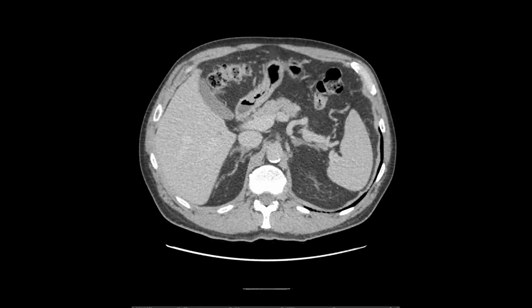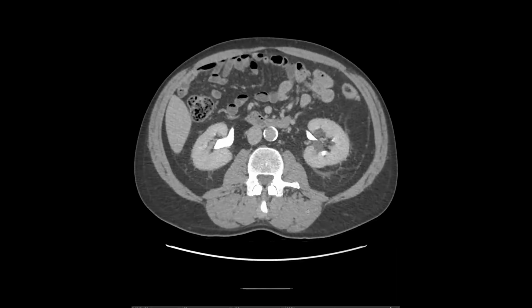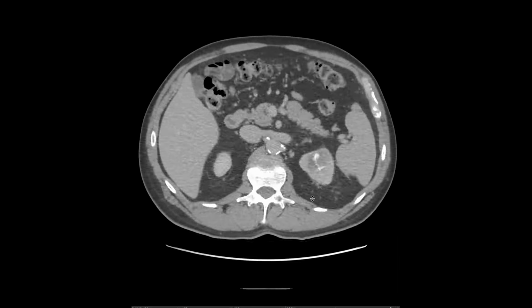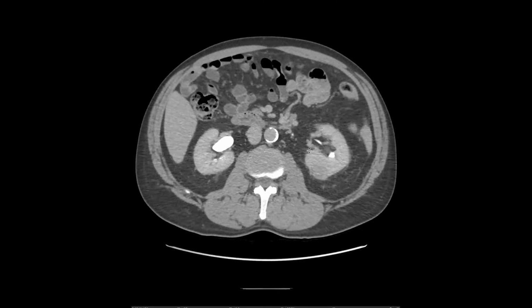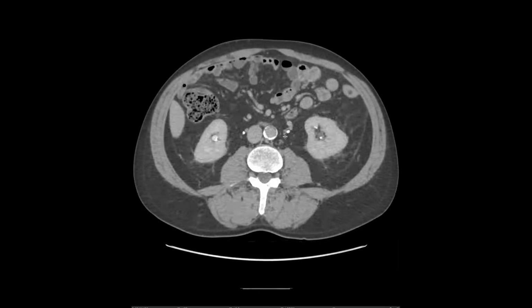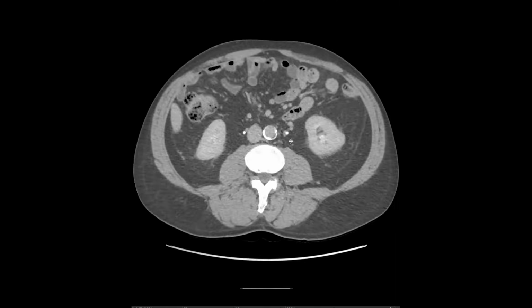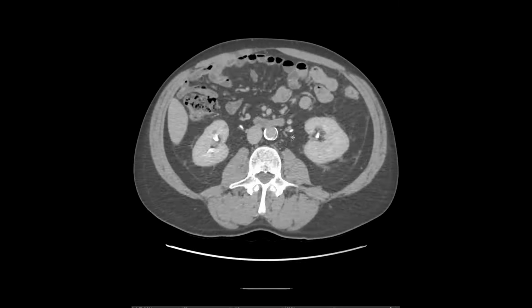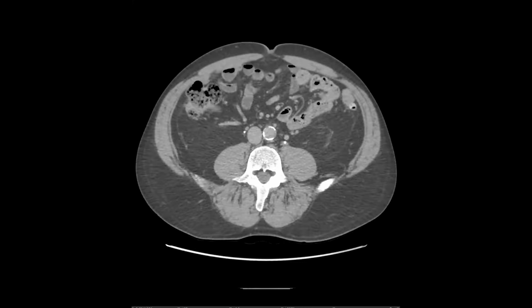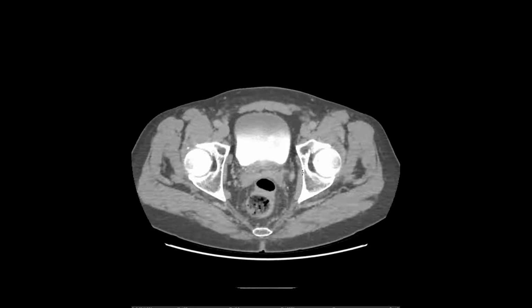Well, could you trace that ureter somewhere? It looks like a ureter, but then trace the upper, yeah, actually you can kind of trace it right there. So I think right here, and then there is a here. So there's a partial, it's not a complete duplication. I think it's just a really long upper collecting system and lower collecting system that merge here approximately, and then there's a single ureter that goes down to insert in the UO.